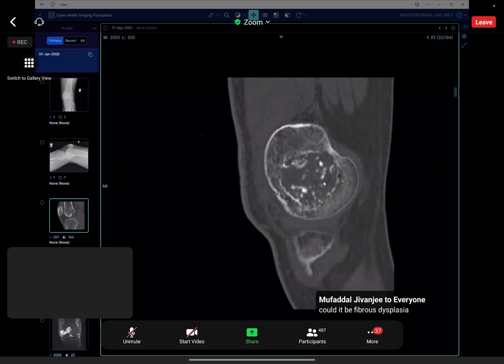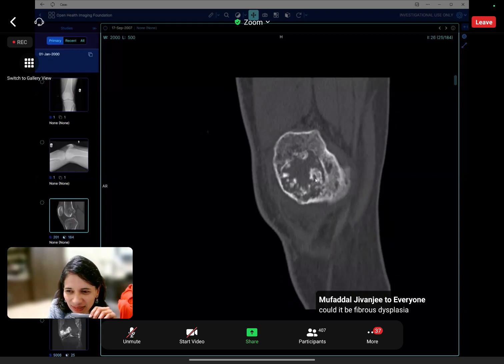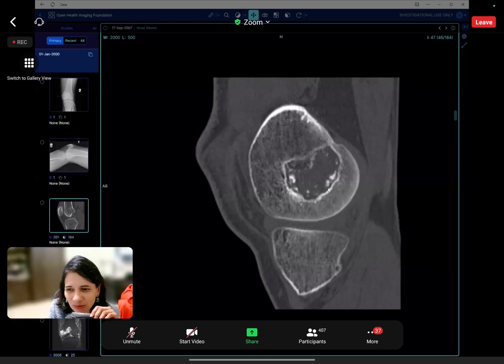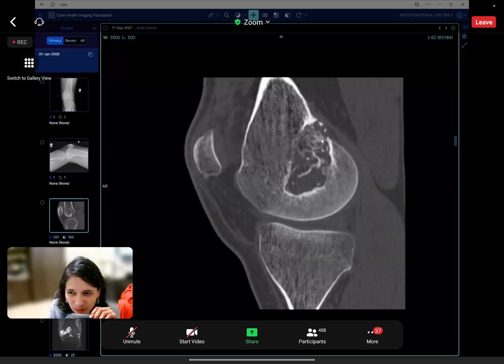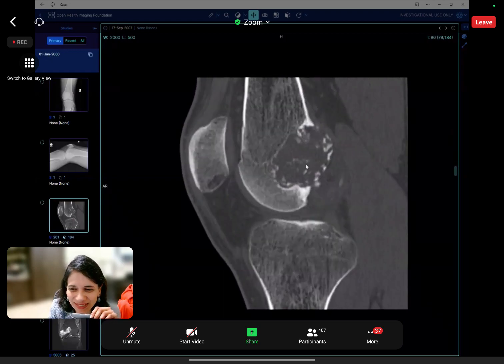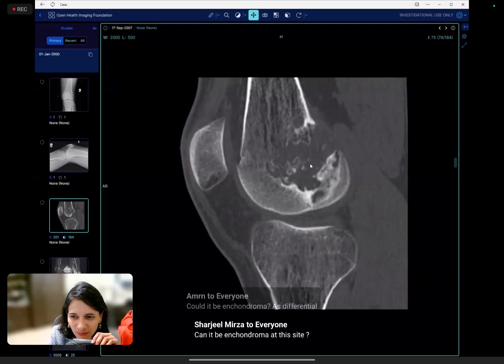And so I was going to show you the CT just to confirm the ring-like, arc-like calcification. That is a very nice example. But remember, chondroblastoma can have a breach and all that. Then I thought it's going to confuse you even more, because you'll think, oh, it's aggressive. So that's why I didn't show you that. I thought, okay, I'll leave it at that. But this is a chondroblastoma, that's all.